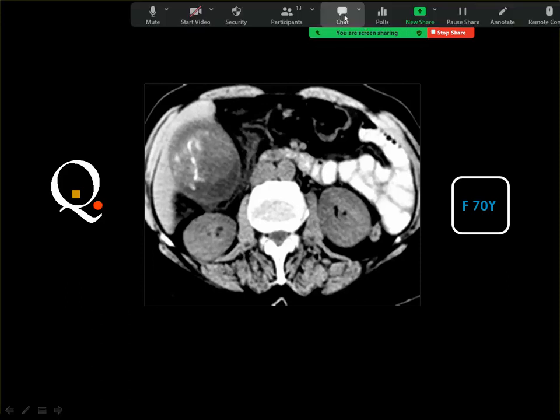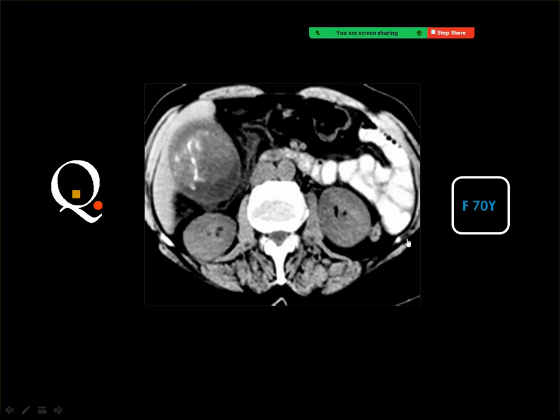If you look carefully at this study, you can see that the gallbladder is distended with a big mass inside the gallbladder, and the mass showed some linear calcification. You know that any gallbladder mass should be suspected as carcinoma until proved otherwise.